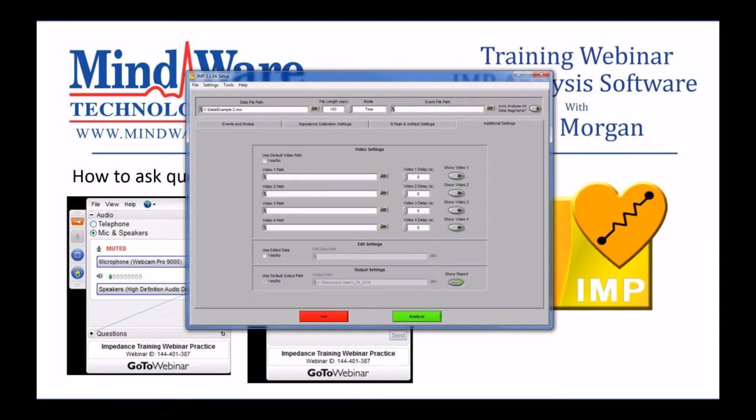This will allow you to offset your video relative to your physiology, either back in time or forward in time, a certain number of seconds. And this is useful when your video and your physiology are not perfectly in sync, or if you're using a non-triggered video solution, so your video and your physiology are started completely independently of one another. There is a route you can take to view that data in time with your physiology using this delay box.